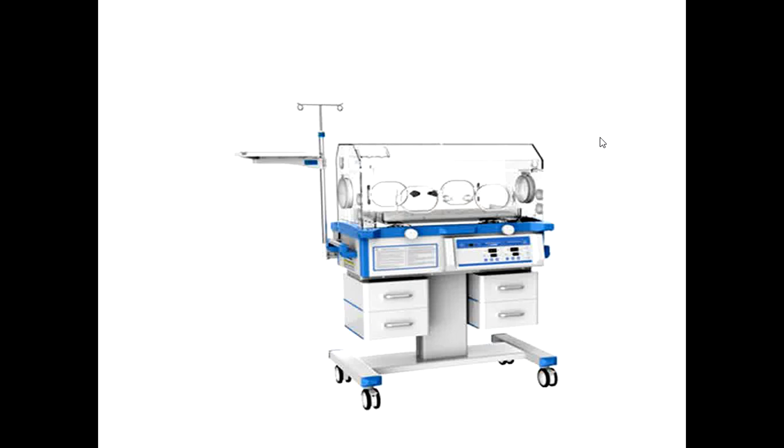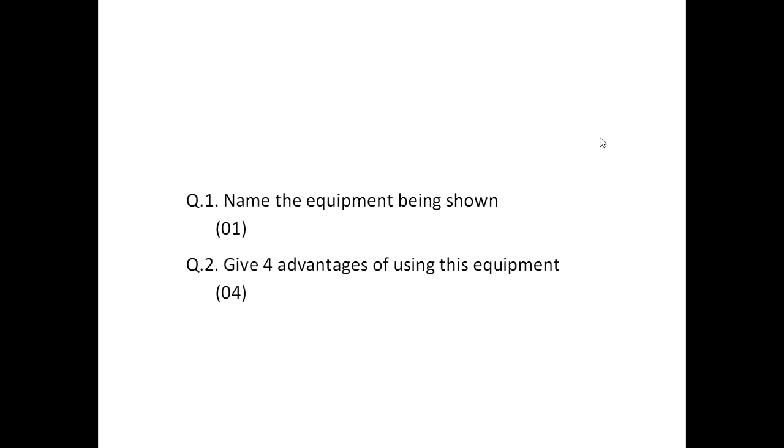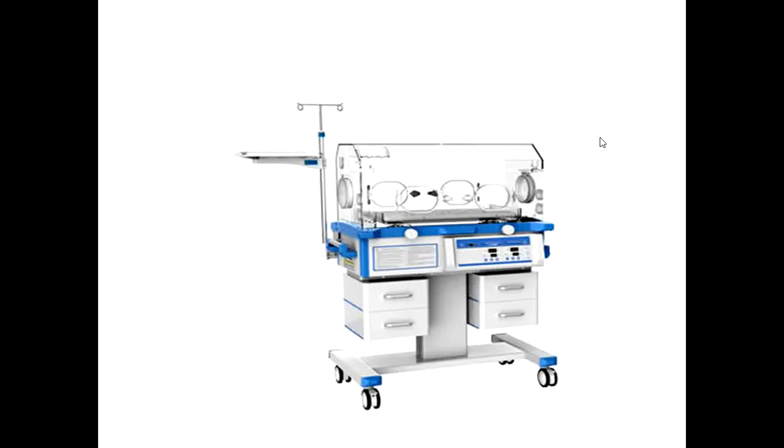This is Neonatal Incubator. Four advantages of using this equipment, like for thermoregulation, for humidification, for isolation or prevention of infection, barrier nursing, minimal handling. These are all benefits, and we can visualize the baby during all this management in the incubator.